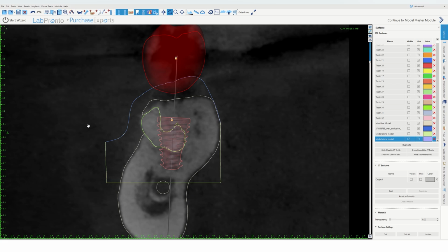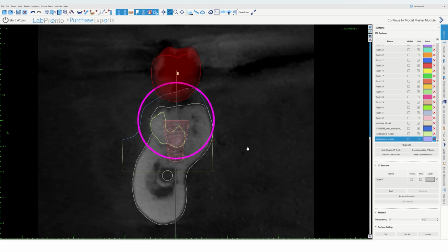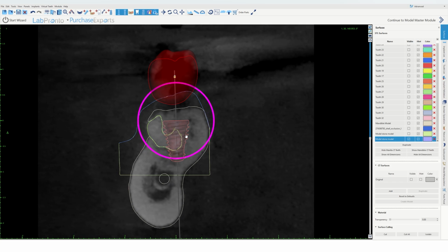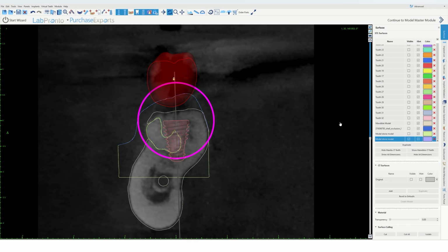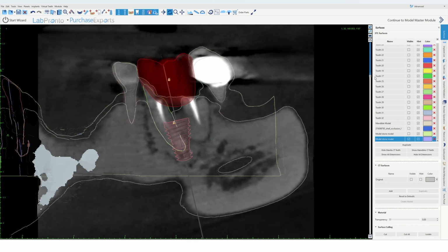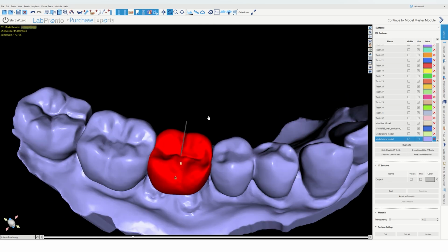This is the lingual. This is the buccal. Remember, the functional cusp of the mandibular teeth is the buccal cusp. That's the cusp that's going to take most of the load of chewing, assuming the bite is not in cross bite. Okay, this might be better. Let's see. Looks great here, but that does not tell the whole story.